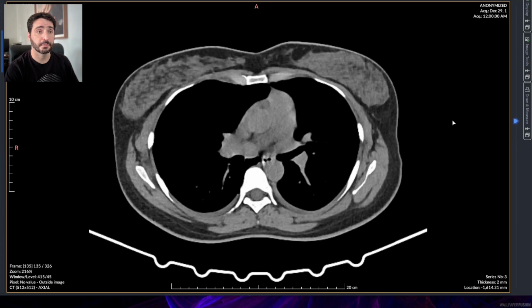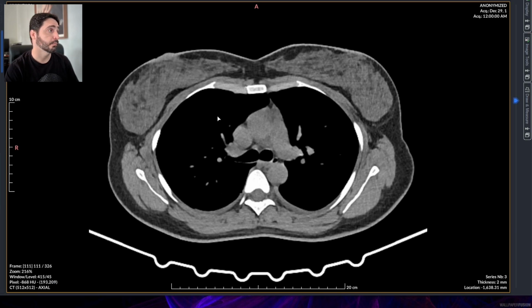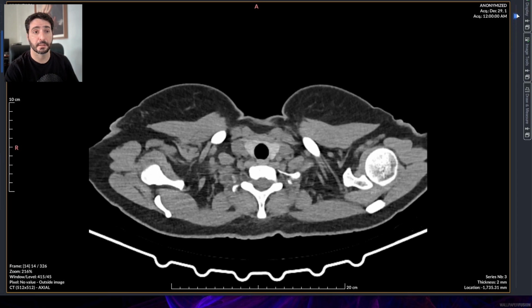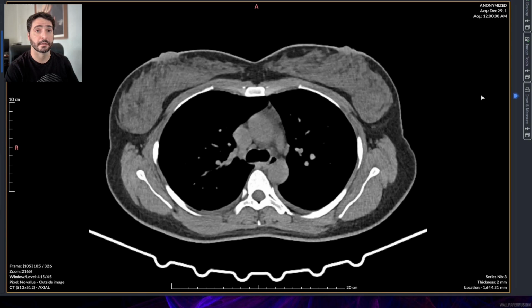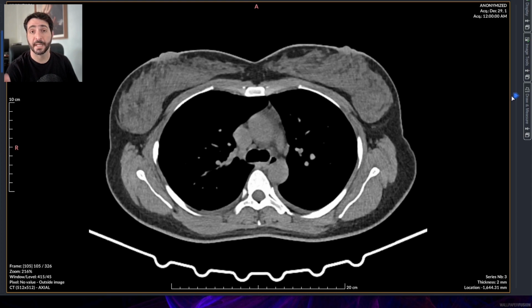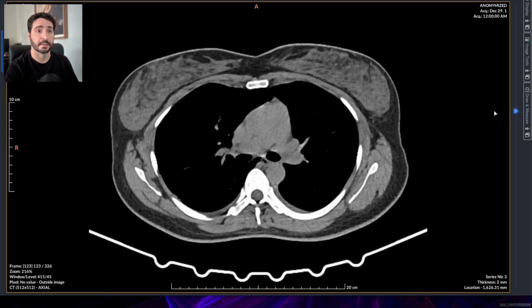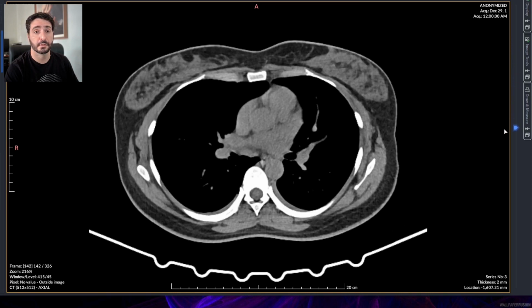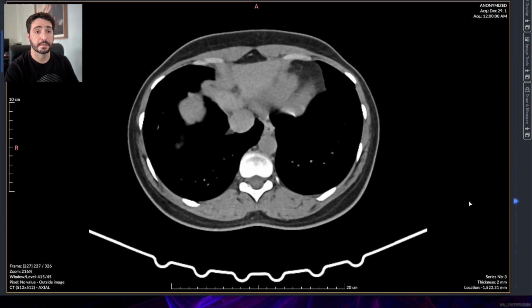This is the soft tissue window. As you may see, the lungs are all black, just like the air around the patient. And we are looking for possible lesions that might correlate to the complaints of being stabbed, but by someone that just wasn't there. Was it a poltergeist? Let's see. We can see the rib cage, the spine. We can see soft tissue, the breast, the muscles, the subcutaneous tissue and the skin all over.